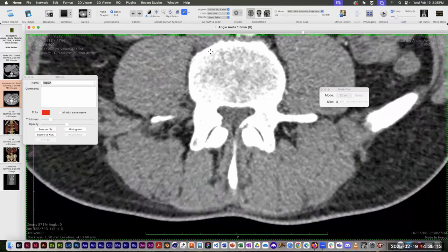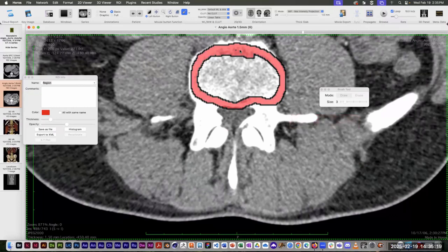So this one I got to paint the whole body in. And you can see just how horrible, sloppy a job I'm doing, just again, in the interest of time. It's still taking way too long, but hopefully we'll get reasonably good results from this.